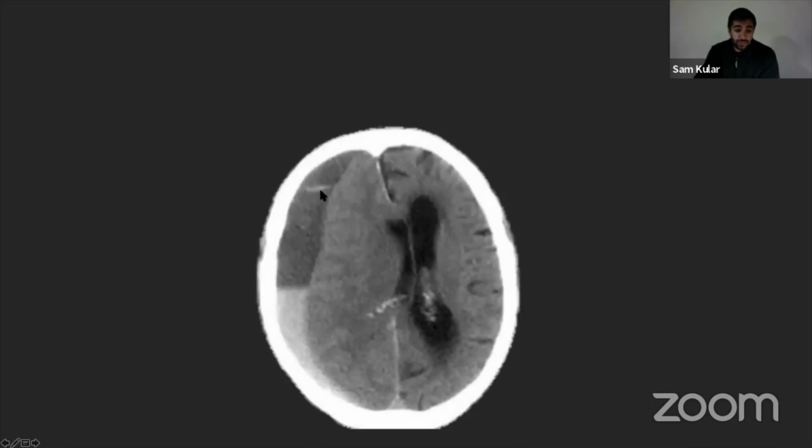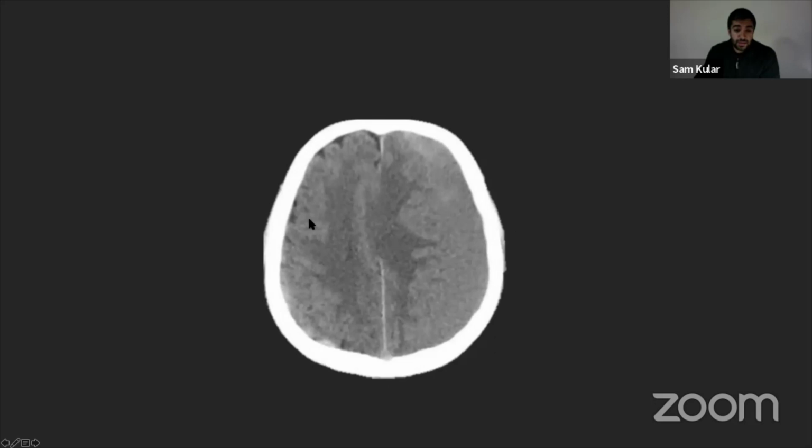We may get mixtures of subdurals, where we get acute blood in a chronic hematoma. So we'll have classical layering. Because active acute blood is more dense than watery old blood, the deeper acute blood will appear lower or dependent, and you'll get this layering effect where you may see an acute on chronic hematoma. This is often a very tough case to detect, particularly if there's not much of it.